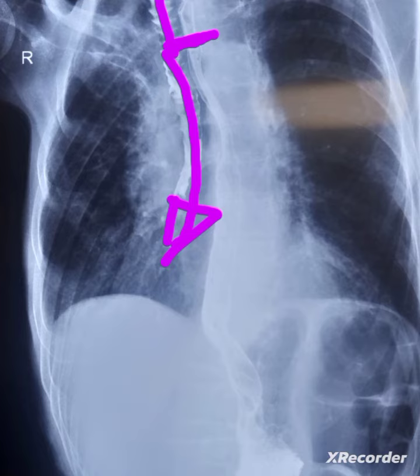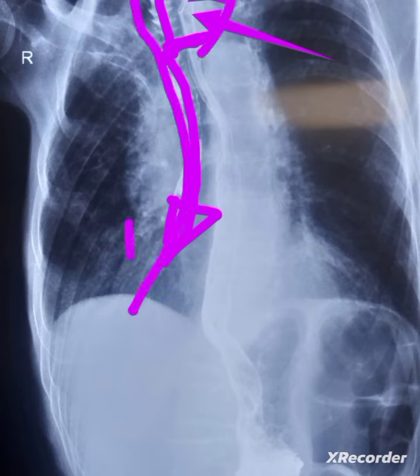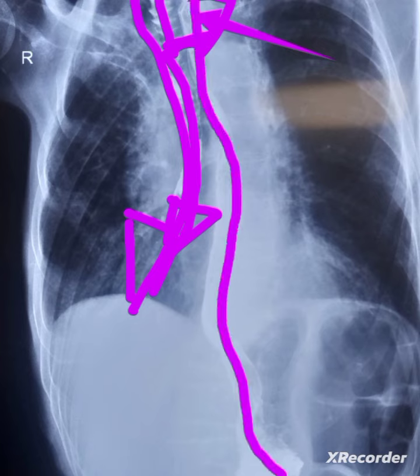While the endoscopy that was done shows a circumferential thickening in the upper portion of the esophagus. So this was a case of esophageal CA leading to dysphagia, and upon barium swallow, the patient aspirated. Some of the barium has gone to the trachea, and some of it has gone to the esophagus and down to the stomach.